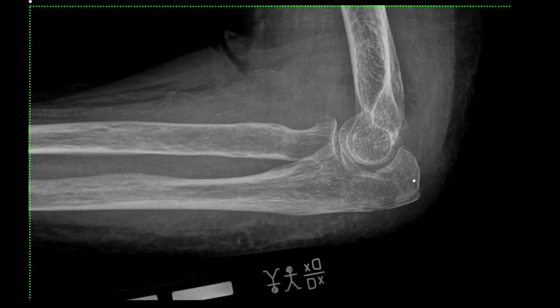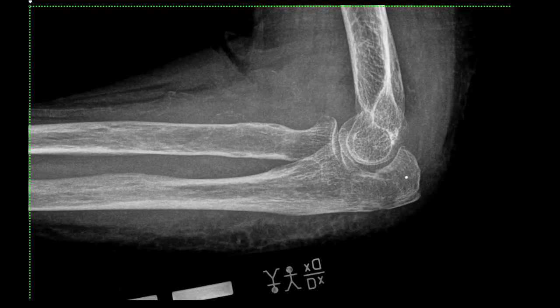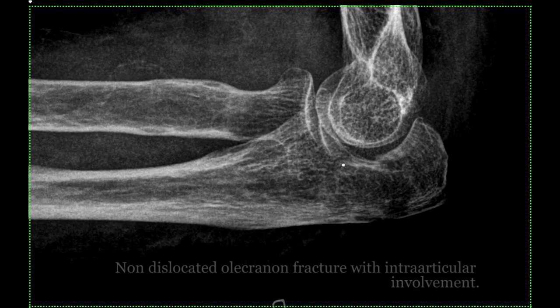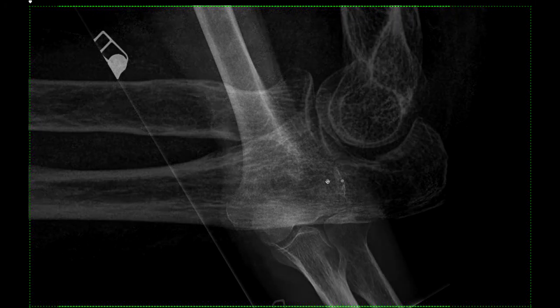And we have this angle, and I was about to give up on this patient, but in the end I found something sticking out. And it's this little part here. This little part is subtle enough, but I call it a fracture, and the clinic was perfectly around this place, so bingo, we had it, guys. Let's see what else we have.